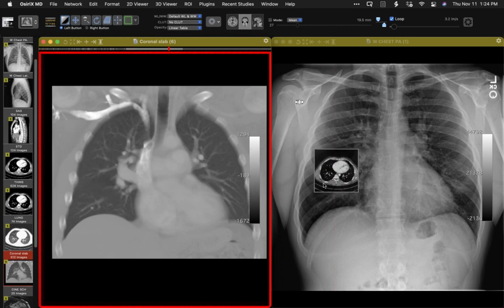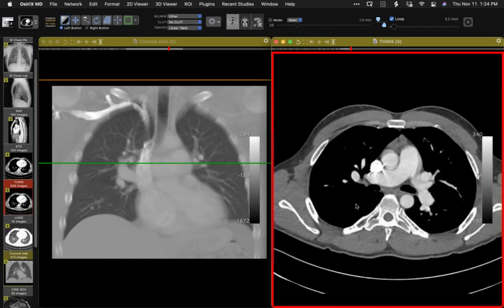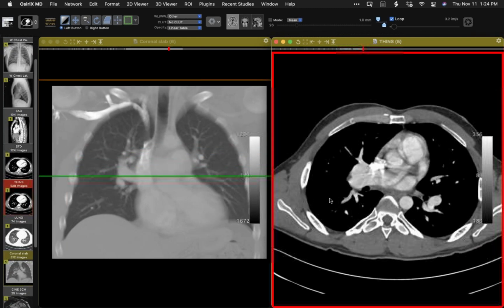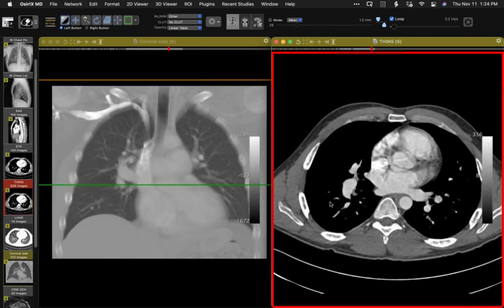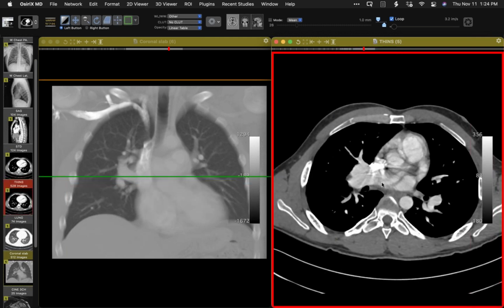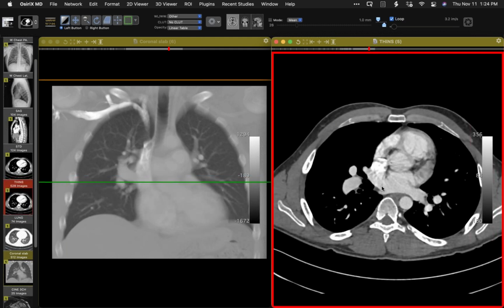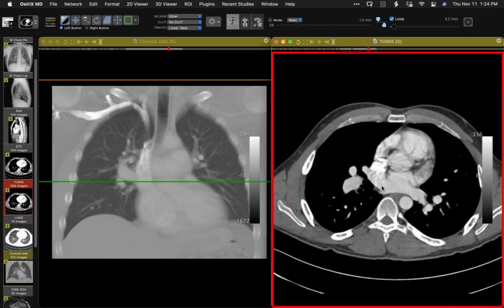I wish I had a CT to show you that was with cardiac gating, because I really can't easily diagnose the presence of what I believe is a superior sinus venosus ASD up here. If you actually see it, let me know. But that's the diagnosis we have right now.